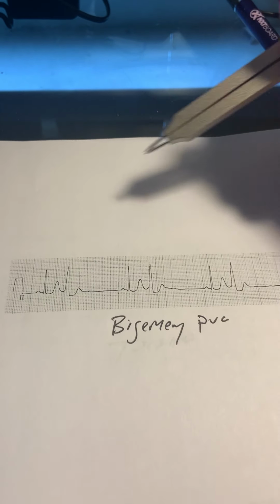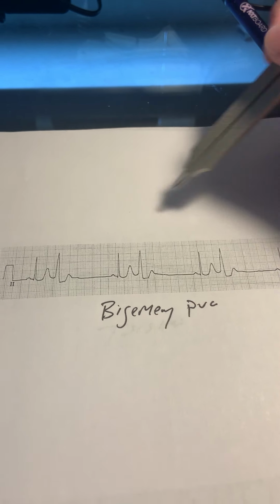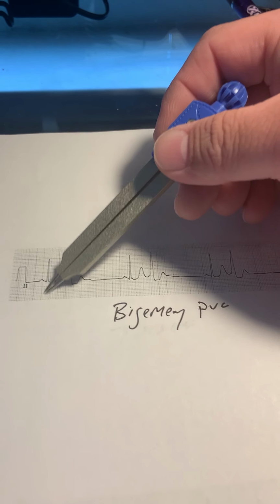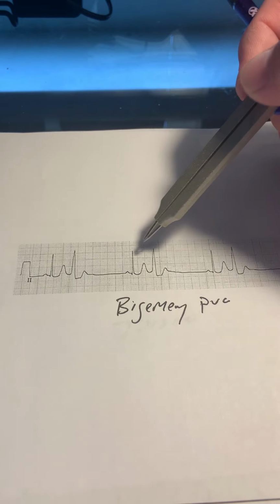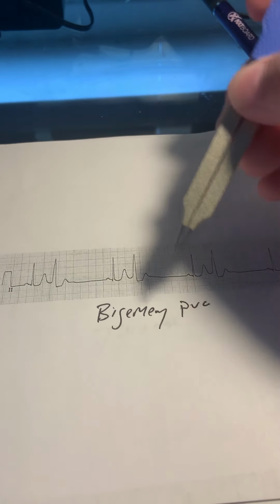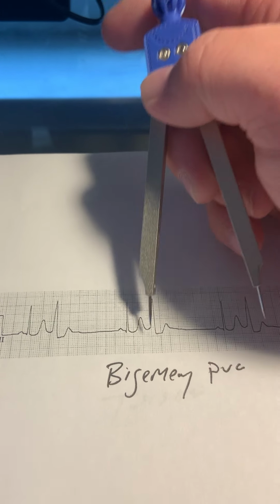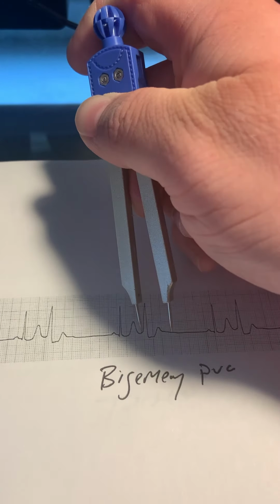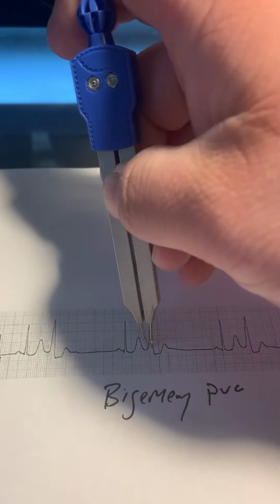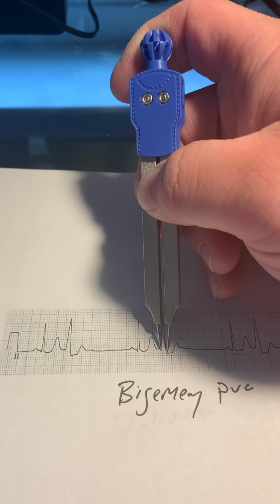This is pretty simple. These are bigeminy PVCs. Bigeminy meaning every other beat. Okay, so we've got a sinus beat here and a PVC here, sinus beat here and a PVC here, and you can see they go all the way across. So I know somebody out there is gonna be like, that's not a PVC. Yeah, it is.